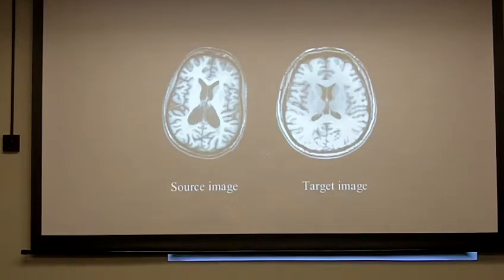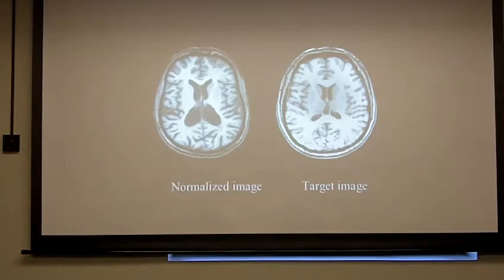We can probably zoom a little bit because the patient's brain is a little bit elongated, and then also we can rotate it, so something like this, and so the position and size now match between the two images, but definitely we are not satisfied.